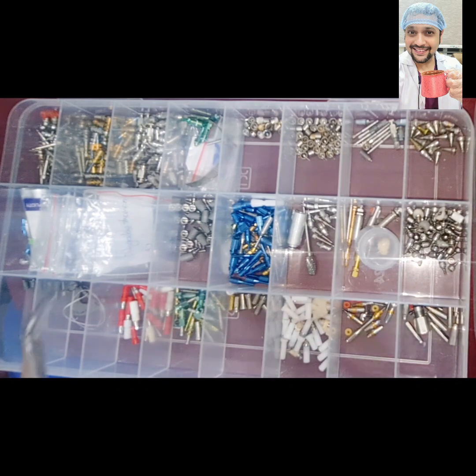I've explained all these basic components of implant prosthodontics. As a revision again, when it comes to the MUA level, after the implant is placed, you can place the multi-unit abutment. On that, the healing cap can be placed. And after the soft tissue is engineered, you can go with either open tray multi-unit abutment level impression coping or scan body.